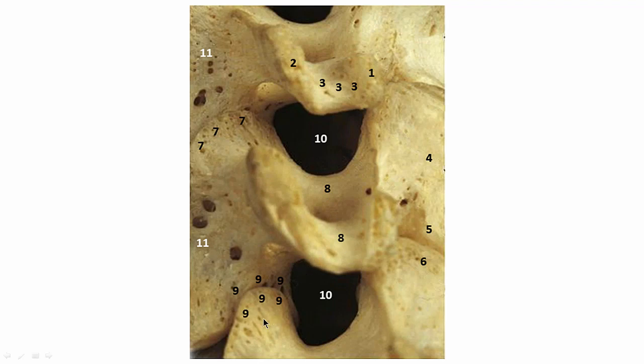Okay, now we didn't talk about this. We can see these better from the front, but this is an uncinate process. This is a double jointed kind of a creature here. This is the body right here, and this would be the front over here. I don't know if you can see this moving or not. There's a little argument about whether or not this is a true diarthrodial joint. There are studies that show a synovial capsule and fluid around this. But anyway, this is the uncinate process, and the whole ball of wax.